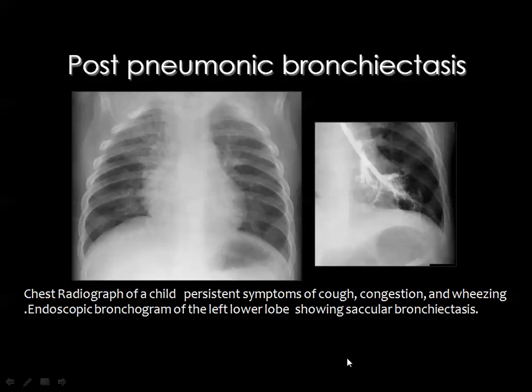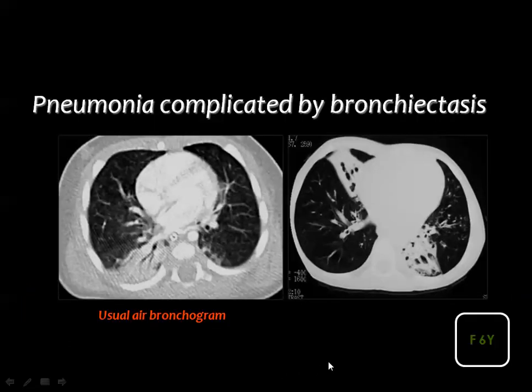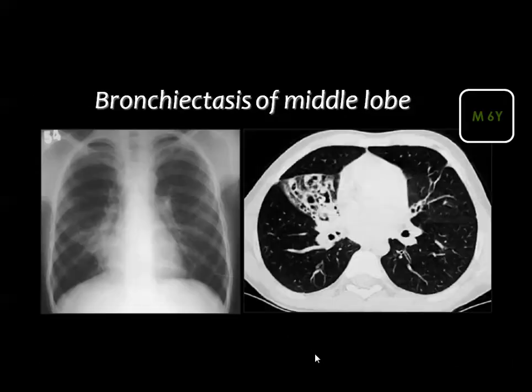But as I have mentioned, nowadays we are able to diagnose bronchiectasis by CT, which is a non-invasive technique and can give very accurate results. Here you see a pneumonic consolidation with air bronchogram inside. In these two areas of consolidation, you see that the bronchi containing air are considerably dilated, and this makes the diagnosis of bronchiectasis easy.